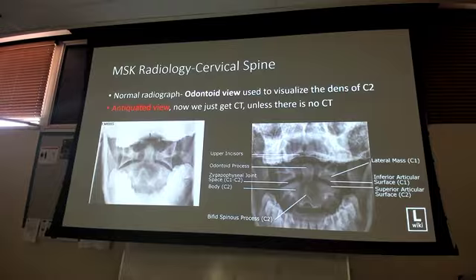And sometimes X-ray can be hard to do that if you don't get a good enough picture. Which is why it is antiquated, but if you're ever in a place and your CT scanner is down, this is what you're going to need to get.